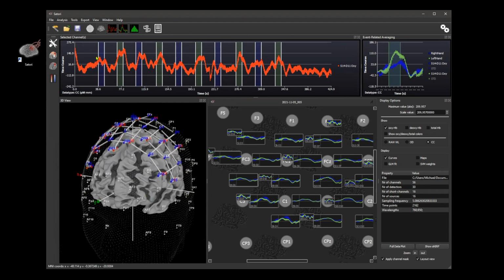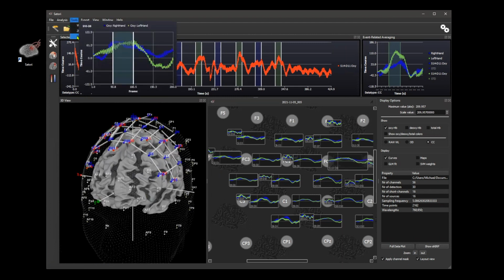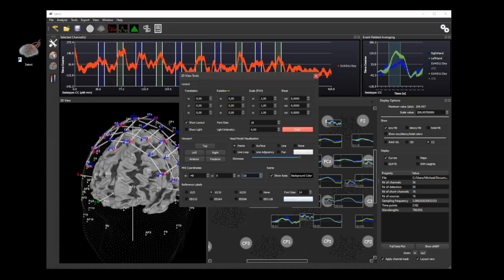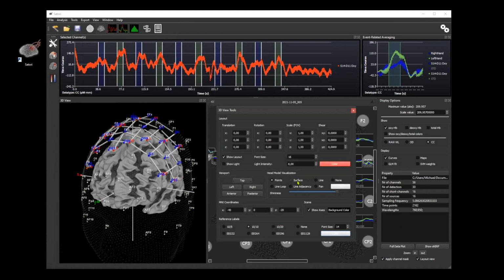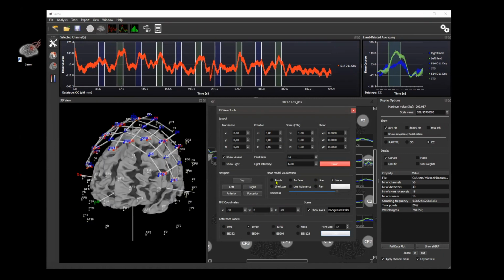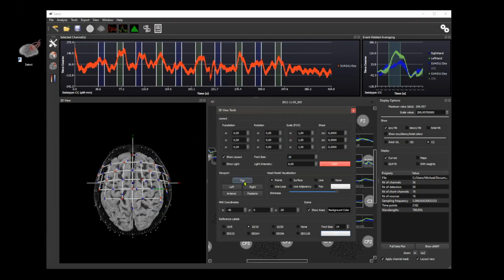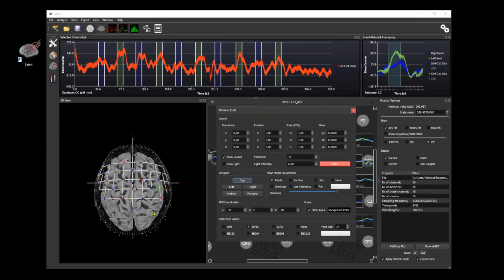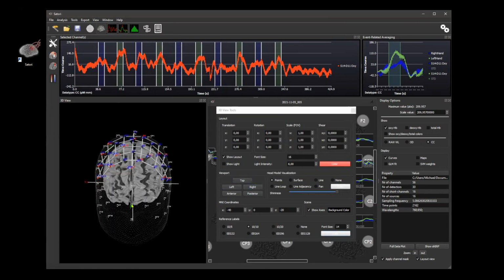Now here it might be interesting to, in the 3D view, so tools, 3D view tools, look at some more features of the 3D view. So we see that there are also head models surrounding it. This we can turn off and turn on, but we can also change it to surface, to line plots, loops. In addition, we can move to specific positions, as I said. So if we don't want to use the shortcuts, we can just use the buttons here. And we can go back to this view.